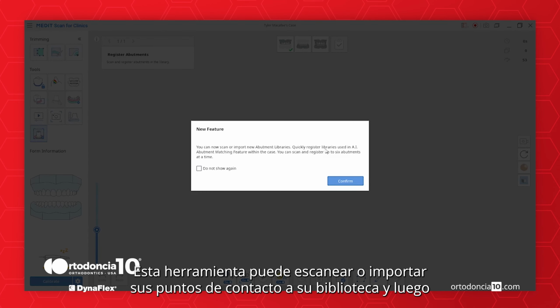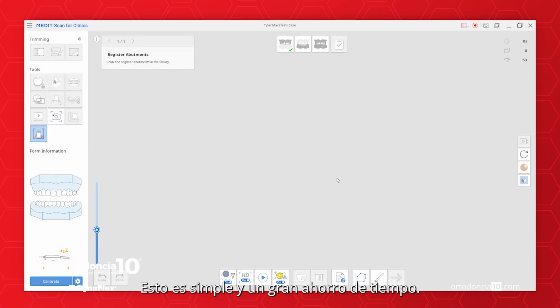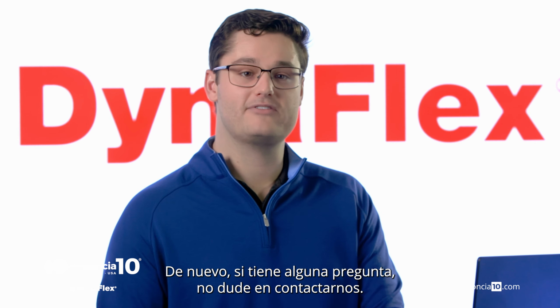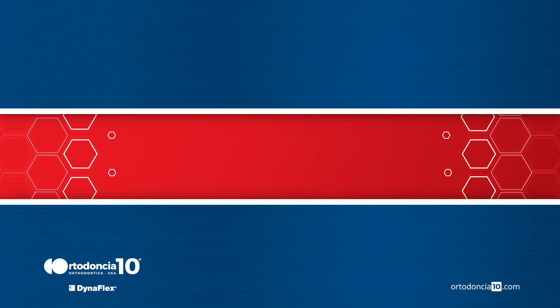Lastly, I'd like to mention the new abutment registration button. With this tool, you can scan or import your abutments into your library and then register them for AI abutment matching. This is simple and a great time saver if you're in an office that deals with a lot of restorative work. That will cover the trimming and utility tools section. Again, if you have any questions, please feel free to reach out. I'm more than happy to help.